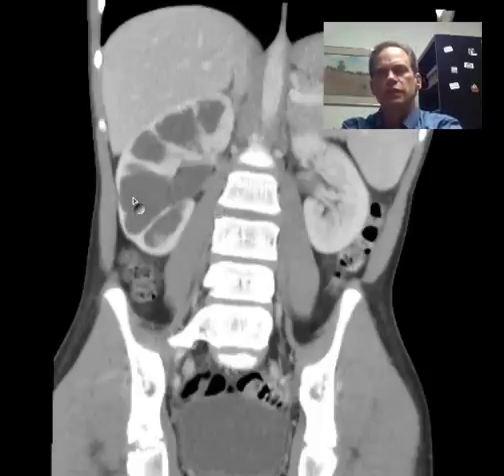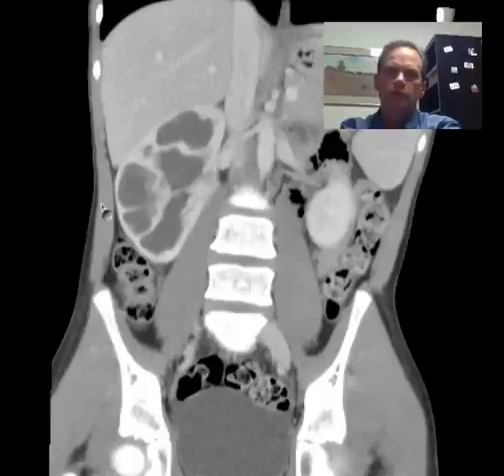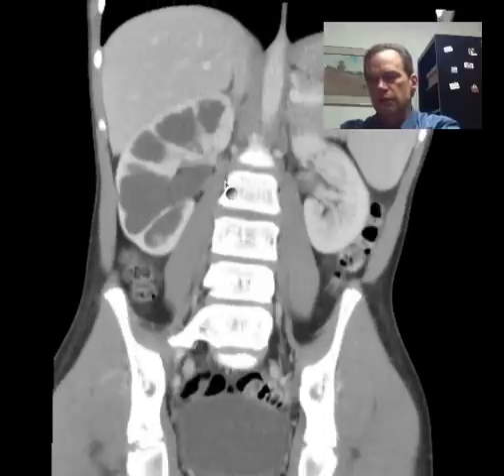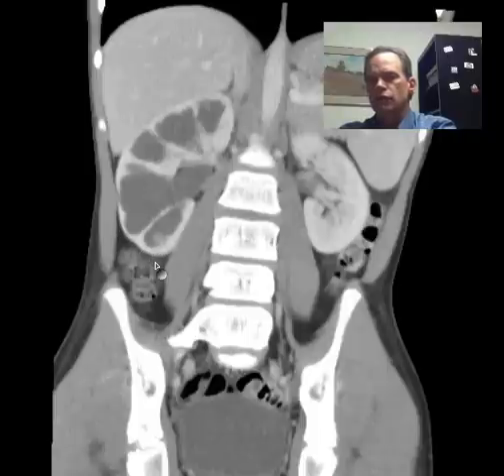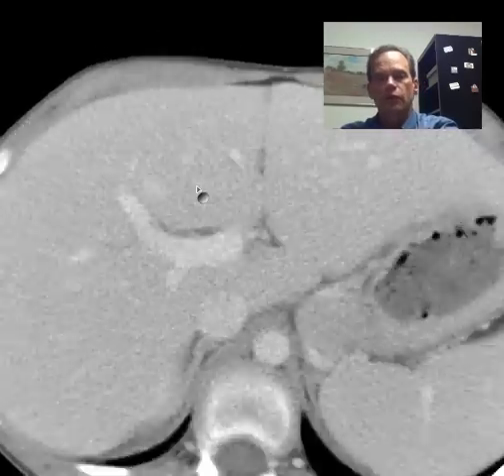And what you don't see here that you would have in an acute obstruction is an indistinct margin of the kidney, and you don't have stranding in the perirenal fat. If this kidney were that backed up acutely from a stone, besides the fact that the patient would be writhing in pain, the renal cortex would not look nearly as clean and neat as this, and the surrounding soft tissues would be infiltrated. And remember, the kidney is situated in the perirenal space.